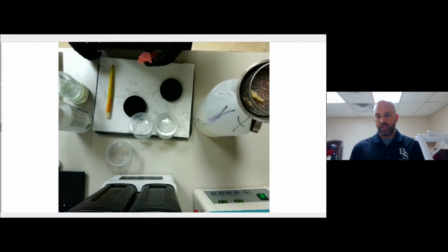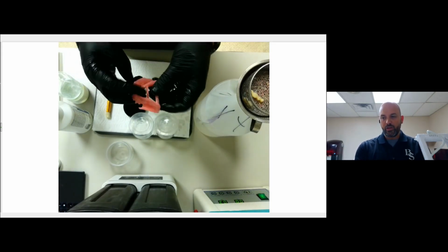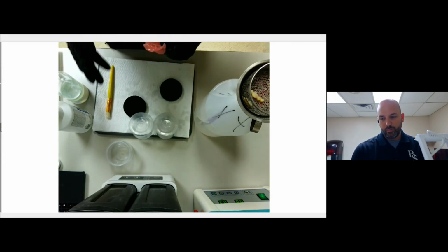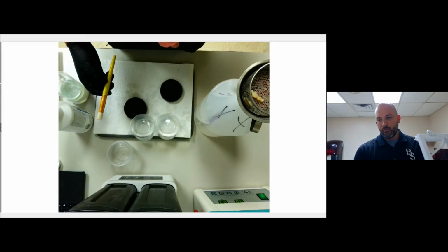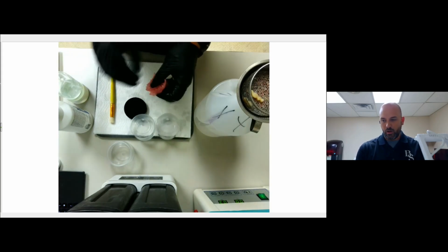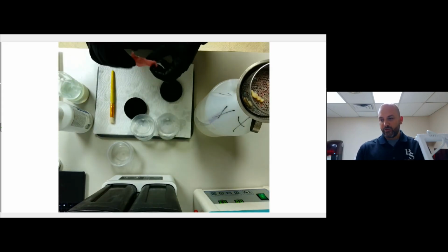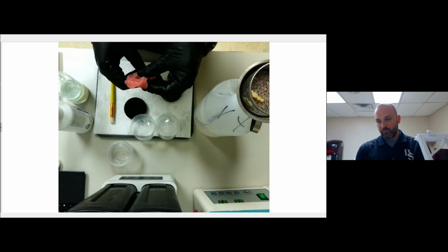At this point, you can see how they're nice and shiny still. What I want to end up with is a matte finish. So I'm going to put some excess alcohol in here and use a brush. I'm going to air dry this first, then if there's any shiny spots left, I'm going to brush it with alcohol and continue to dry it back and forth. I'm going to come back after I get it nice and matte, and then I'll show you the end result. So that's what it looks like when it's shiny.